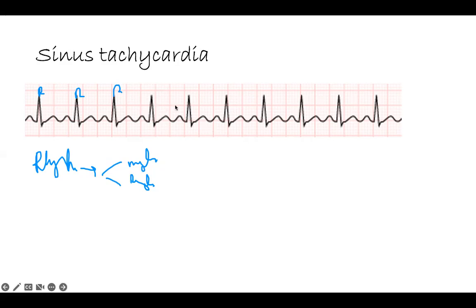Sometimes it deviates a little bit, but you can eyeball it, or you can put your finger on it and measure from here to here how many lengths. So you have 1, 2, 3, 1, 2, 3, 1, 2, 3. This is a little bit off, but it's the same. So I have a regular rhythm. You can even eyeball it and say, oh, this looks regular, right?